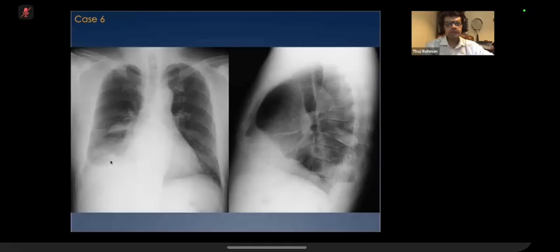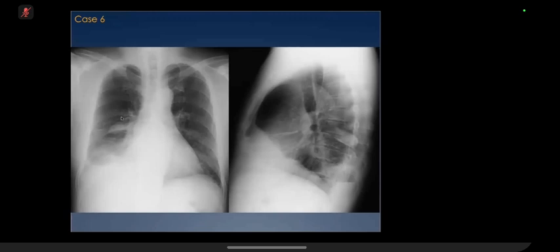So how would you differentiate a lung abscess from empyema? Or how would you take forward a hydropneumothorax? This is hydropneumothorax, isn't it? No, this is an air fluid level. Now, how do you know if it's a hydropneumothorax, which is air and fluid in the pleural space, or air and fluid inside the lung on an X-ray? How do you take it forward? Ultrasound would be very useful.